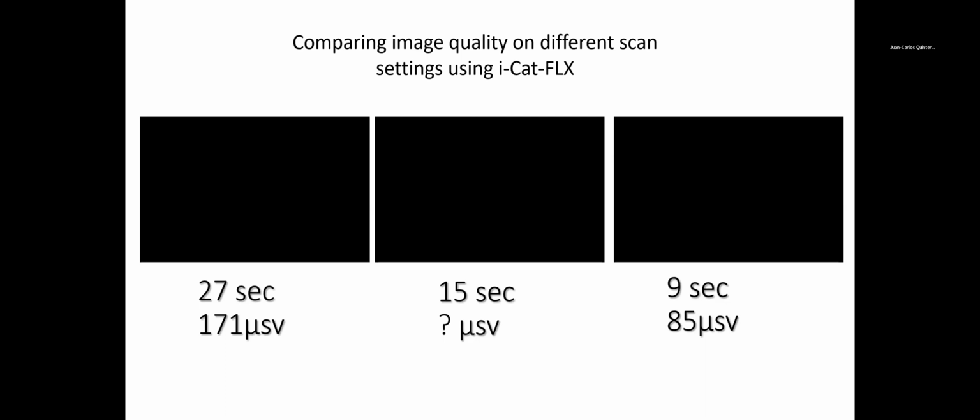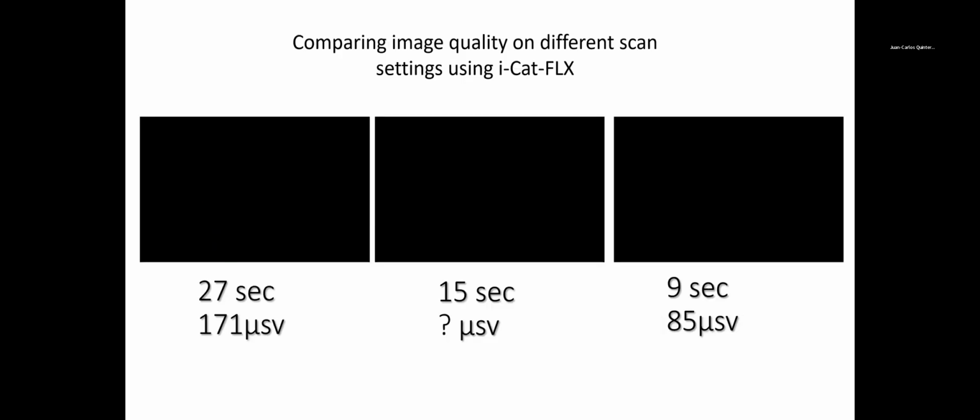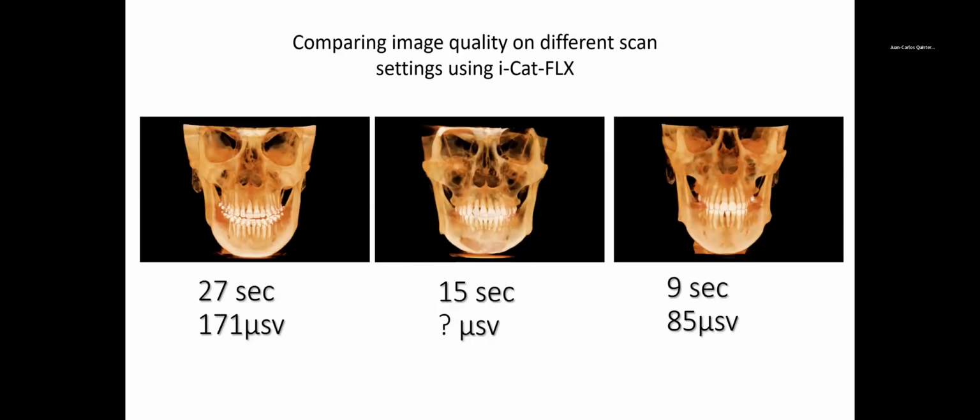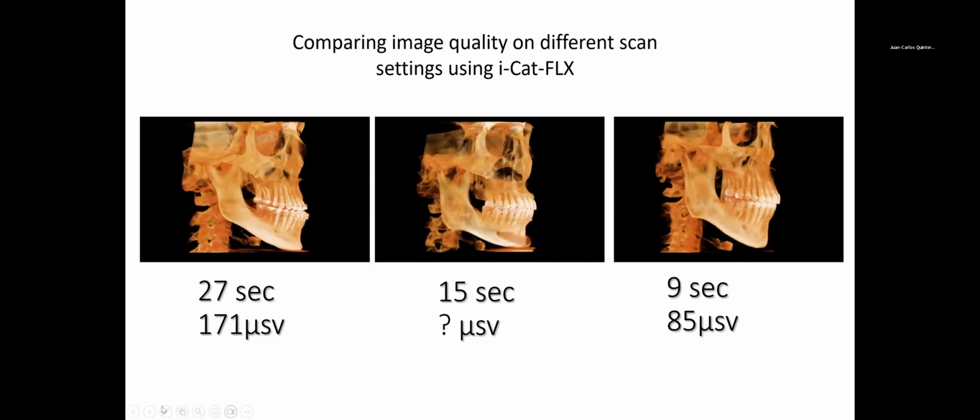So is there a difference in the requirements for in vivo model? Do we need a high dose scan or low dose scan to get an in vivo model? But this is what gets really interesting. Okay, so let's quickly compare the image quality on these 3 different scans.